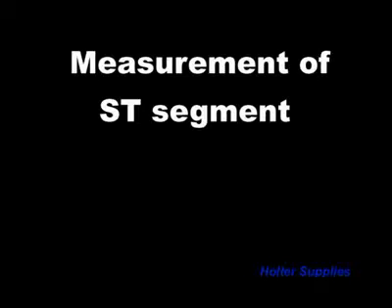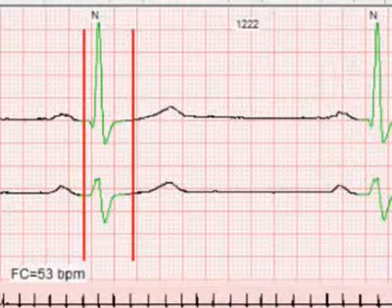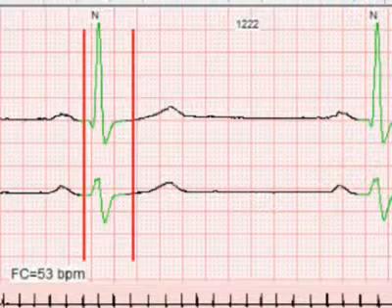Quick Reader allows a measure of segment ST elevation. This can be very useful to diagnosing patients at risk and to see if there's a link between certain rhythm disorders and eventually detect a crisis. The measure does not take place until classification is validated. It is to avoid computing of wrongly classified QRS.